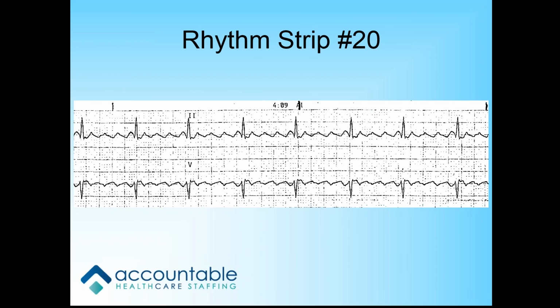Jess. Hello, sorry. Oh, no worries. Let's take number 20. Okay, that looks like a flutter. Very good. Excellent. Any questions, anyone?